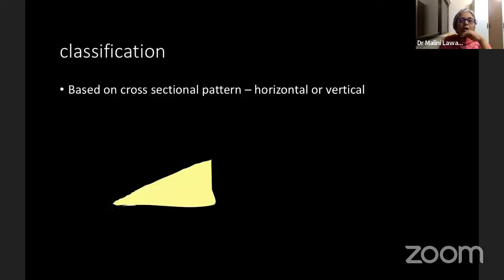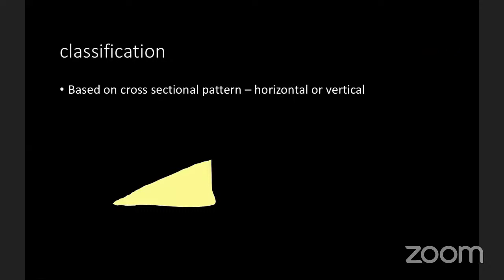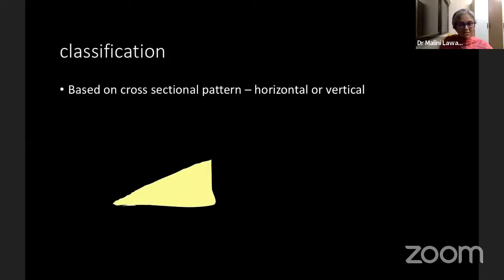So now we looked at how a normal meniscus looks on MR. We discussed how exactly we identify abnormal signal within the meniscus. When is it really a tear? And now we come to the next section. What is the type of tear? Can MR help us identify it?